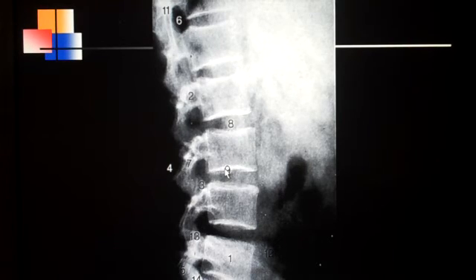Number 9 would be the inferior vertebral end plate, and number 8 would be the intervertebral disc space. 6 is labeling the IVF, and 11 is labeling this rib that's coming down right here. Number 7, again, superior process here, inferior process here. What connects the two is the pars interarticularis. If you see this really white image right here at the tip of that number 7, that is the transverse process coming straight at you.